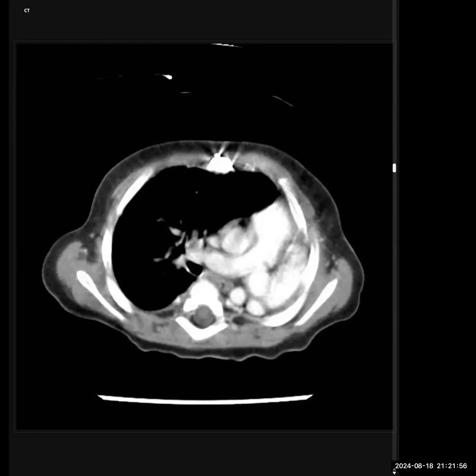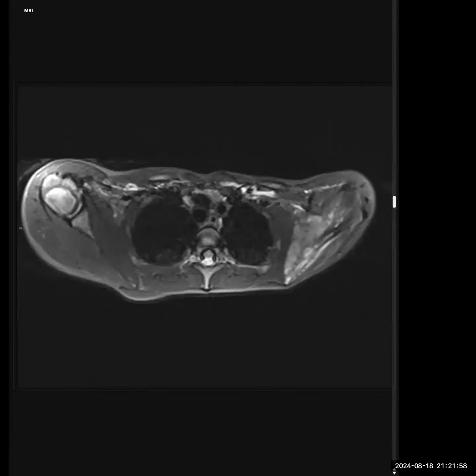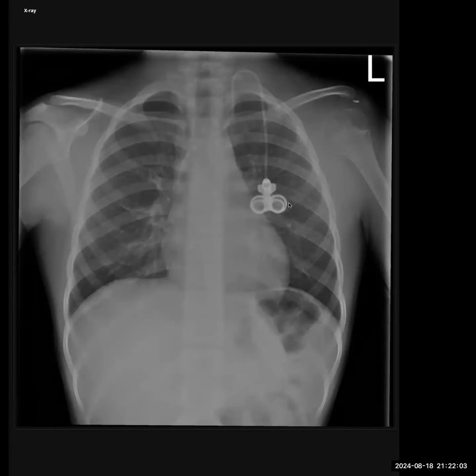We'll just quickly go through some of the cases. So this was the first one. I deliberately started with the post-operative image to sort of make you identify that there is no scapula on the left side.